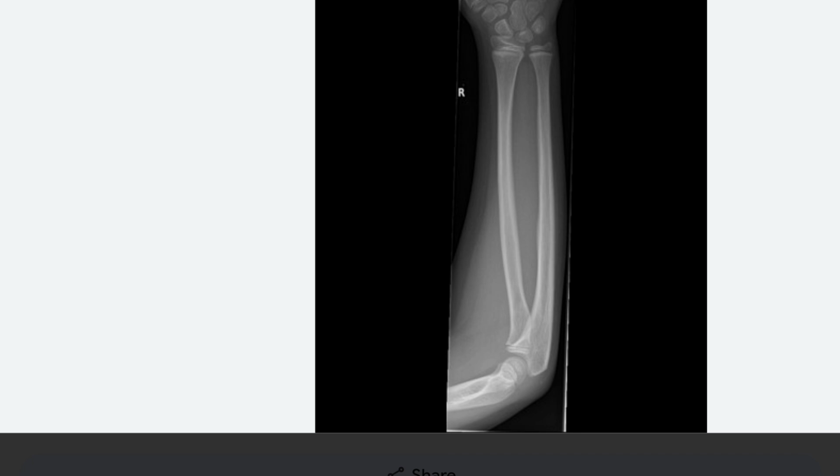How to read X-ray showing fracture. Radiograph showing fracture should incorporate the following: level of fracture. Divide the bone region into virtual thirds or halves and then dictate the site of fracture as upper, lower, middle third or junction of upper, middle third, etc.